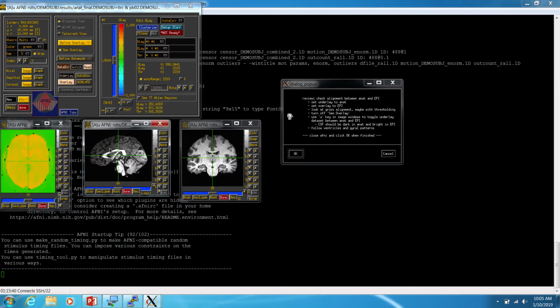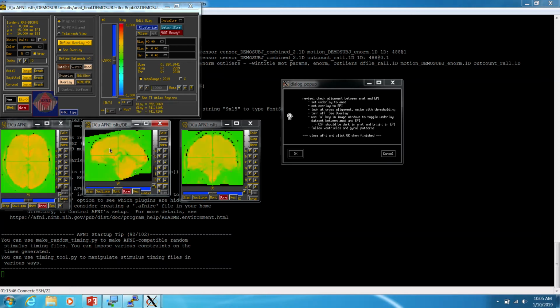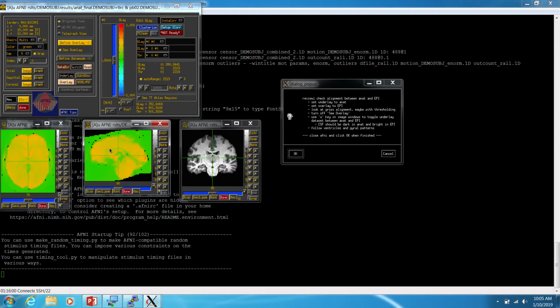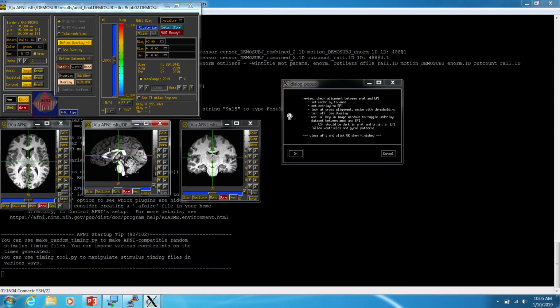So when we flip rapidly through, if you kind of blur your eyes and look at this, it should look really close to a brain. And we're really looking at gross anatomy. So if it was wrong, this is our brain, the other brain might be like that. So that's what we're trying to diagnose. Correspondence is never perfect, but we're just trying to see, hey, does this look reasonable? Does this brain look like it's sort of on top of that brain? Yeah, because the computer matched it.